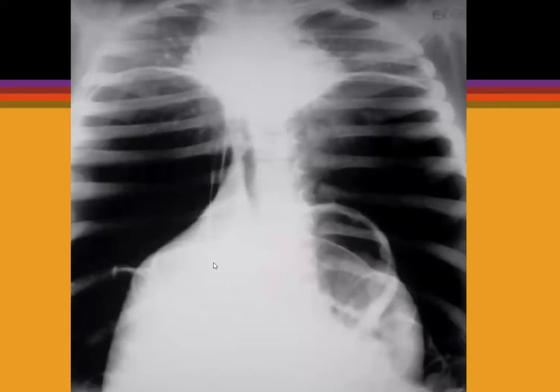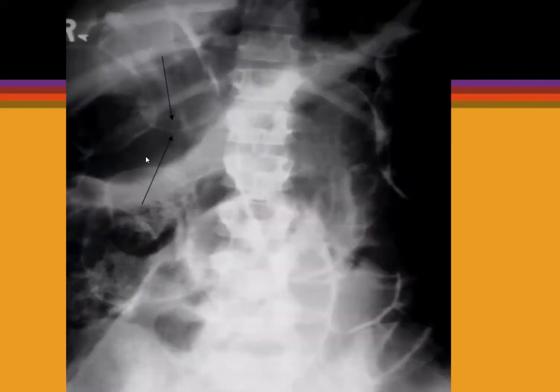These are the hemidiaphragms. There's been a huge intra-abdominal perforation, which has basically displaced the liver edge downwards. And these are bowel loops which have also been displaced towards the centre. You don't see this very often, and I wonder whether this is iatrogenic. Is this immediately after a laparoscopy, because there is just so much air in the abdominal cavity. This is Rigler's sign, air within bowel and air outside bowel, making that bowel wall look much more conspicuous.